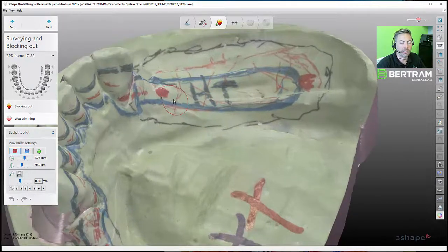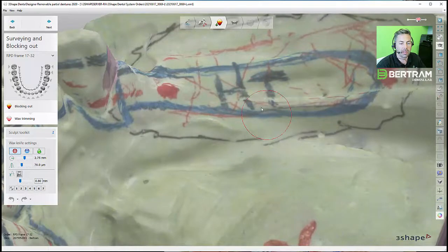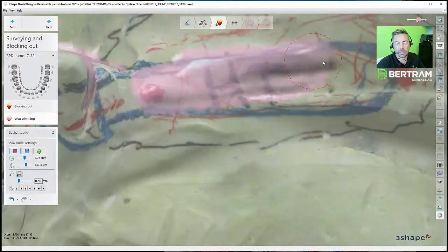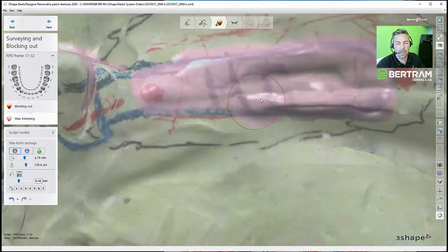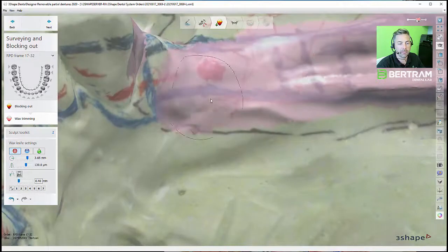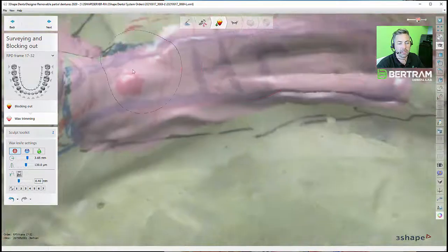So let's start out with that, and we're going to be at that 0.4 on our maximum height setting. You'll see that cap out here in height. And obviously when you're doing this, you're going to overlap your mesh, so it's fine to extend past the drawing.